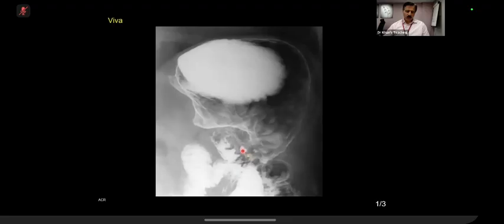By the way, before I take over, can you stretch your imagination? What will be this thing? I can show you a profile image for this also. Here you are. They're going out. These are small diverticules from the jejunum or pseudodiverticulum.